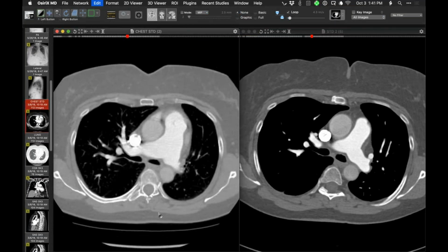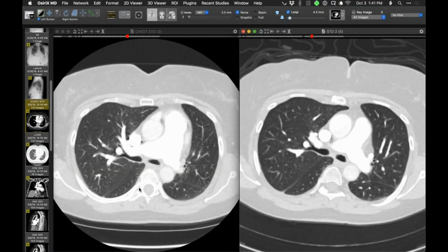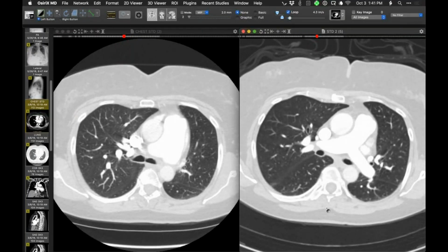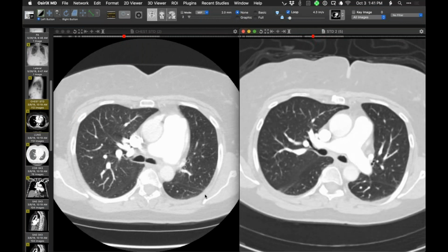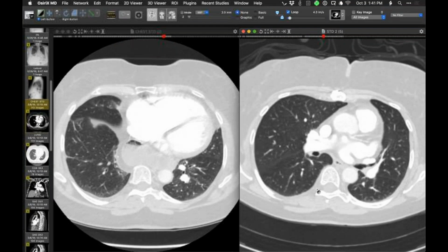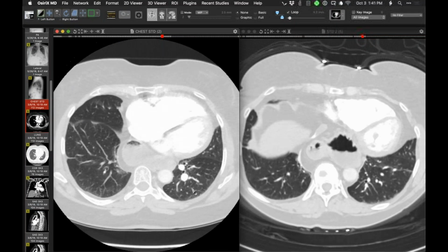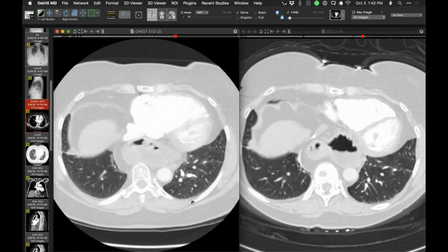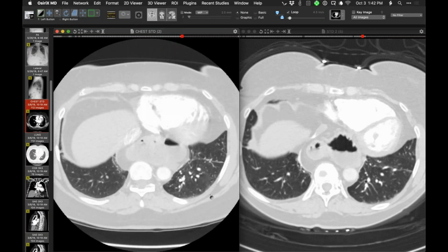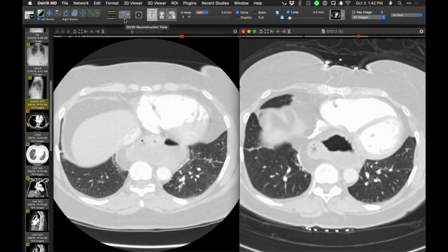Let's see if we look carefully whether we can see, when we look at the lung window, that the perfusion's better and the caliber of vessels is better. So scrolling through the left upper lobe before and after, I can see some vessels are obviously bigger and more blood flow. Let's go down here to the right lower lobe before and after, particularly down here, say. Well, one can see some small changes in terms of perfusion, but nothing super glaringly obvious down there. Okay.